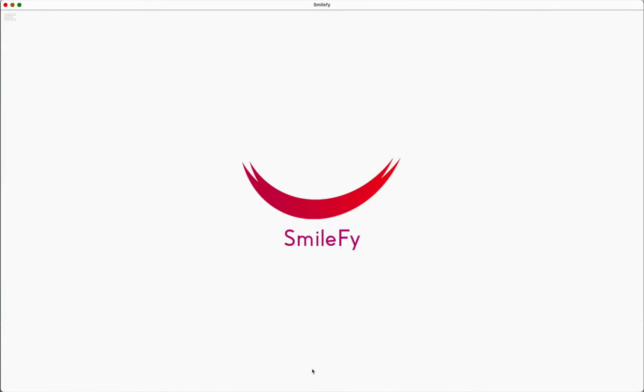My name is Ralph George. I'm the CEO and founder of SmileFy and the creator of SmileFy. Today, we're gonna start a 3D case and we're gonna go step by step, and I'm gonna explain what you need to know to create a beautiful 3D design and a mock-up for your patient.